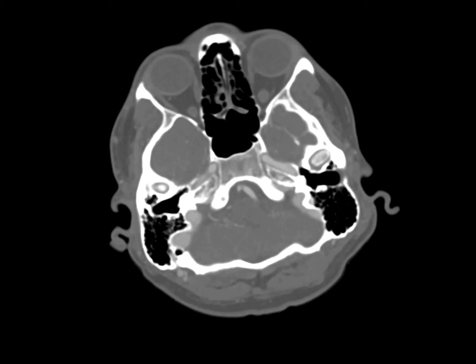In about 10 to 20% of cases, the PICA, posterior inferior cerebellar artery, is absent or hypoplastic. Usually, when it does come off, it is from this V4 intradural segment, though it is also possible for it to come off the basilar artery or from the V3 extradural segments. Very rarely it can also come from the ascending pharyngeal artery as well.